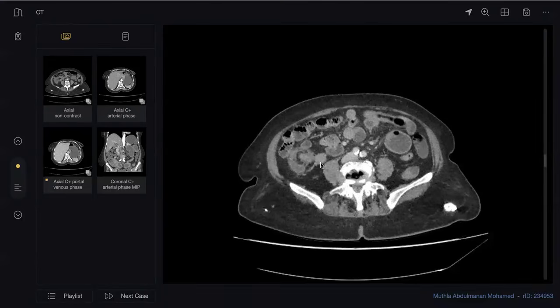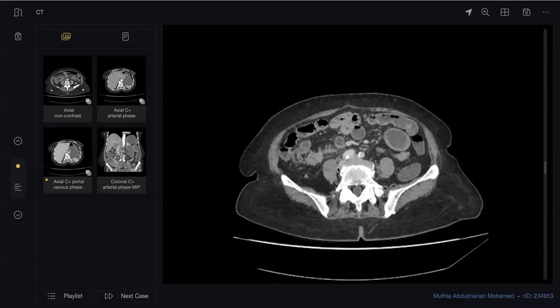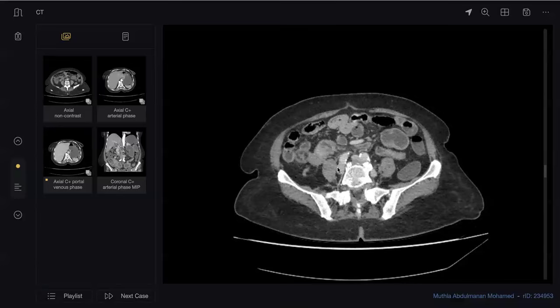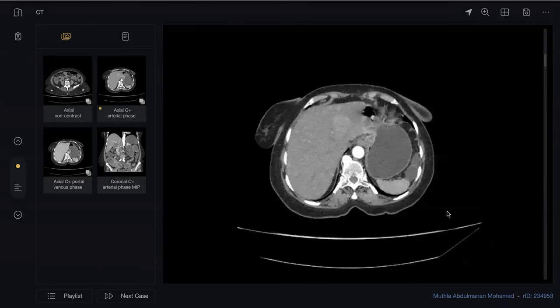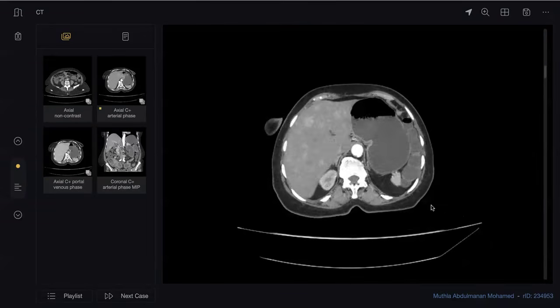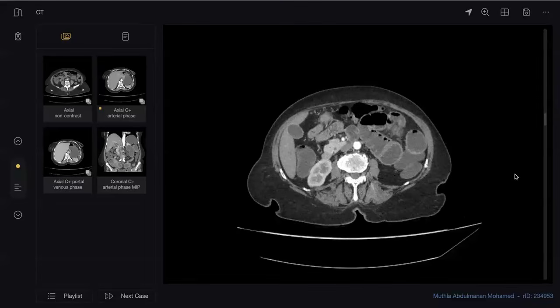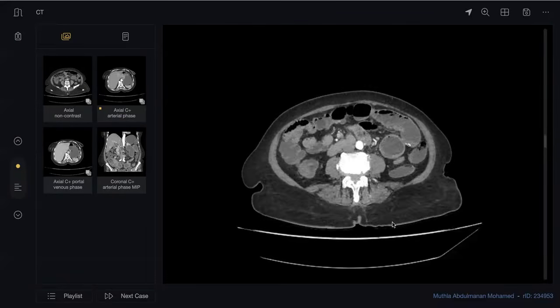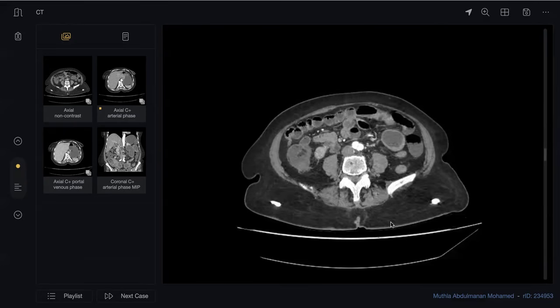And as I see here, this is bowel thickening with stranding surrounding. I am not sure if this is tethering of the bowel or not. See the arterial phase again. Go to the terminal ileum. Yeah, stop there. Go one section up. Stop there. What do you see?